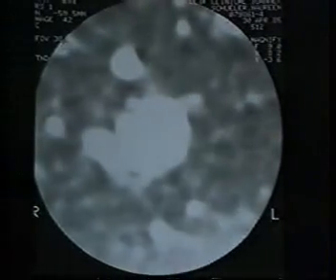We can see here that there are still a larger number of pixels within the patient's nodule that are visible at this same window level. That would indicate that these nodules are denser than the phantom and therefore contain calcium. However, is this enough calcium to call this lesion benign?